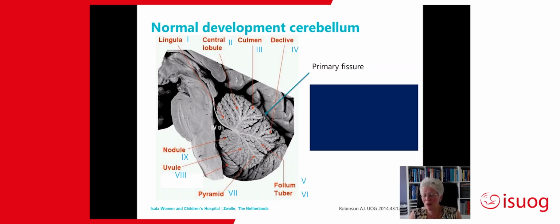And that's why we have sulcation and gyration, otherwise the brain wouldn't fit inside the skull. And we can see a little bit the same in the vermis, only here it's called foliation, like the leaves of a tree, which you can see over here.